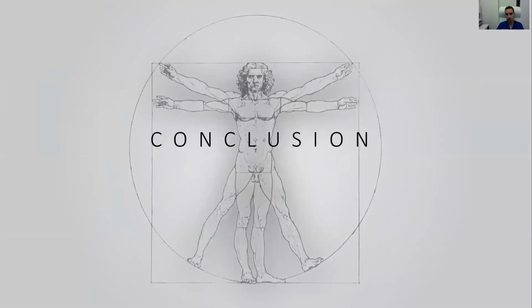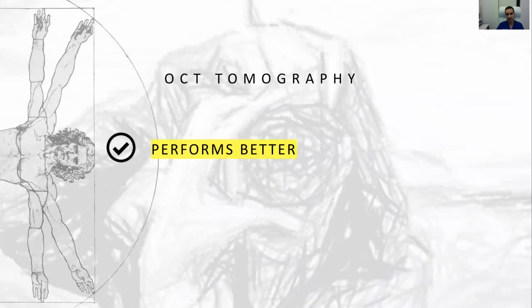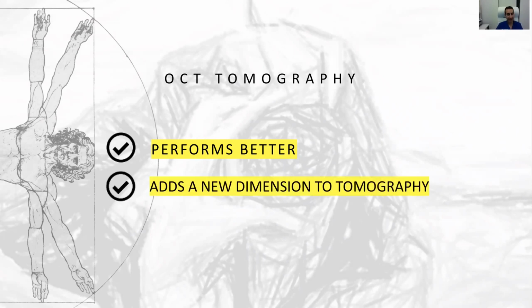So as a final conclusion, I do think definitely that OCT tomography does better, and I hope I showed you examples where OCT is really great in your regular daily practice. And again, it adds a new dimension to tomography. We always think of topography being the surface, tomography being the posterior surface, but actually with this, it's a huge difference. It's everything in between, everything else, like determining things that you would not have been able to determine with a regular Scheimpflug tomography.